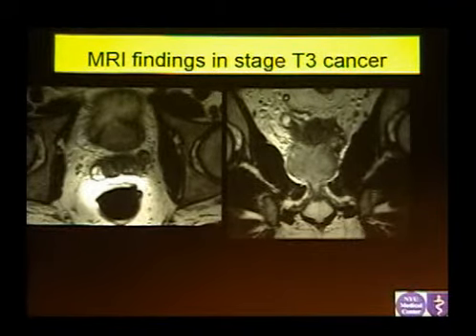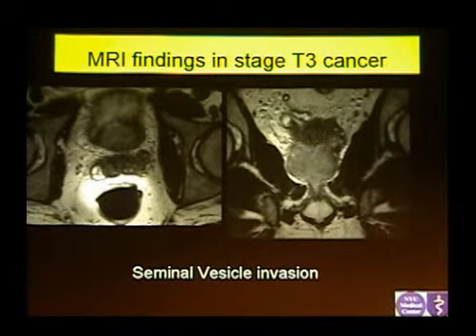So always match your T2 images with the T1 images. Make sure you're not calling something that's hemorrhage a tumor, okay? This is an obvious extensive seminal vesicle invasion, T3 cancer.